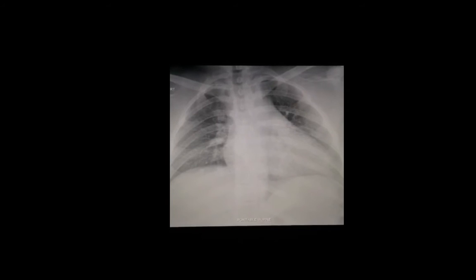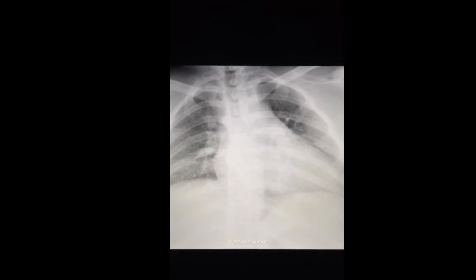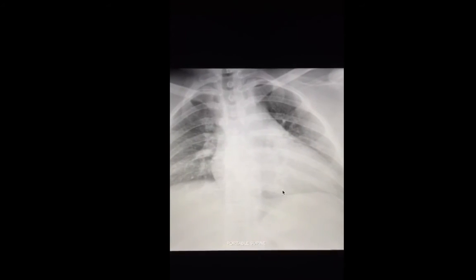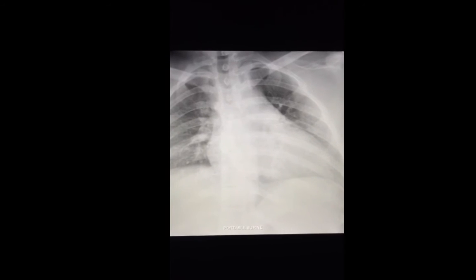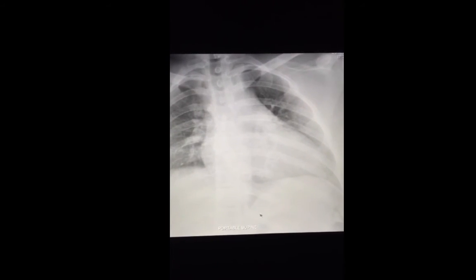Today's snap is a quick snap for juniors. What do you see on this chest X-ray? What's very obvious is that the cardiac shadow appears enlarged. Now, such a finding might make you think about cardiac disease. However, it's very important to notice the way the examination was performed.